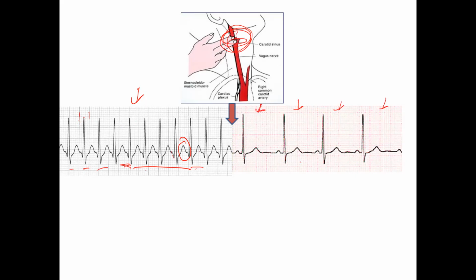So now we can see that there's a P wave and a normal PR interval and a normal QRS. So this is going to be sinus tachycardia. And that's what we call that. Now, we can't call it sinus here because you can't see it. All you see is this big T wave between the R's. And you know it's tachycardia, but you can't tell if it's sinus tachycardia or atrial tachycardia or accelerated junctional rhythm, all those things you'll learn later. You kind of understand that?